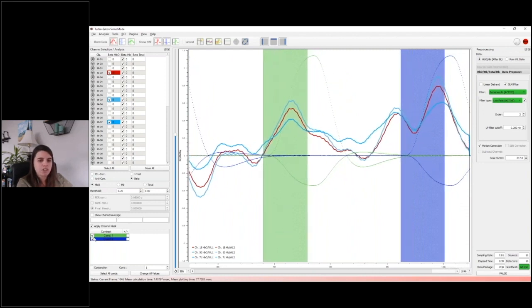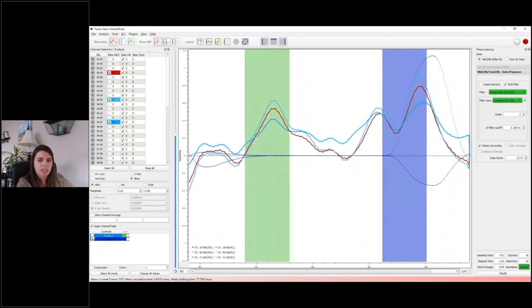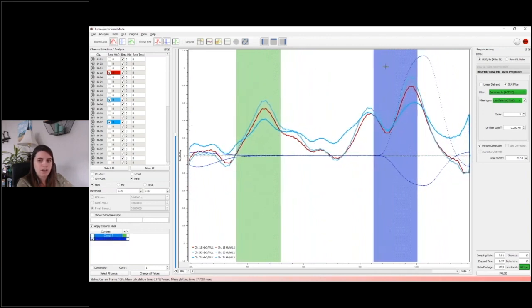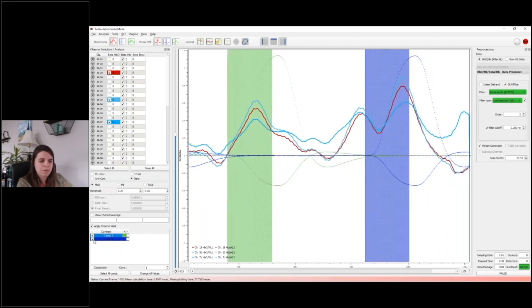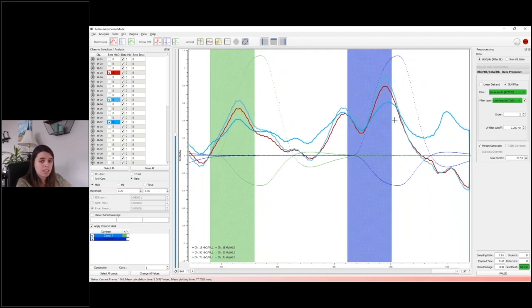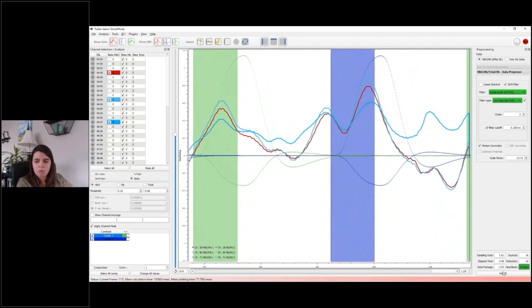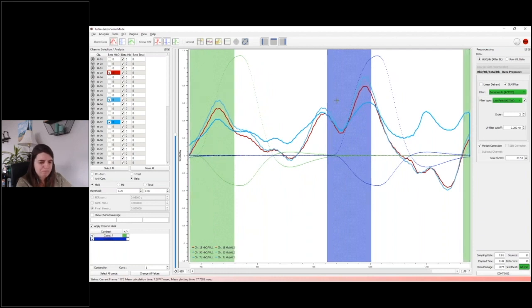I could specify which conditions I want to look at using these buttons down here. So you see that I take away the basis function using these buttons down here. Let's see, I should also note this data is completely pre-processed. Our pipeline that we discussed earlier has been applied. I'll walk through that later.